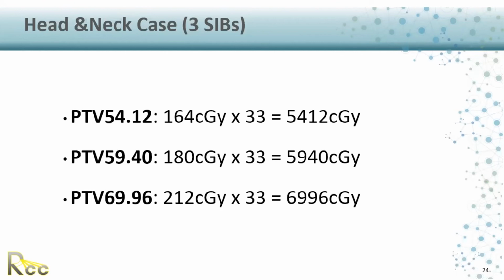And also this goes back to your school and also to your protocol in your institution. Some institutions are using different protocols, so I cannot generalize this, but what we are using in our practice and what I have seen others using is between 150 and 250 as the maximum.